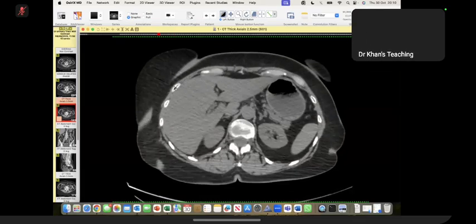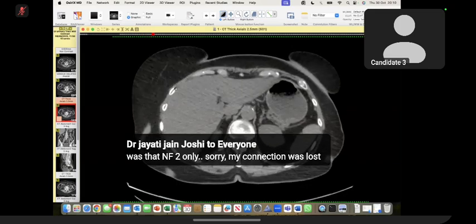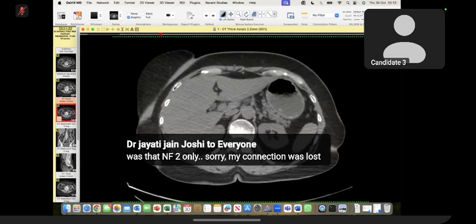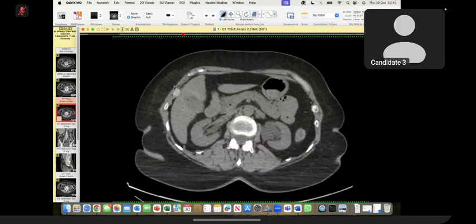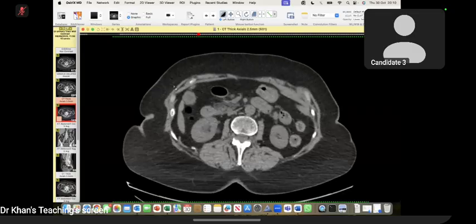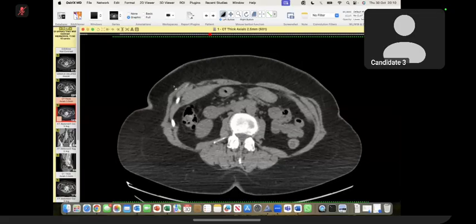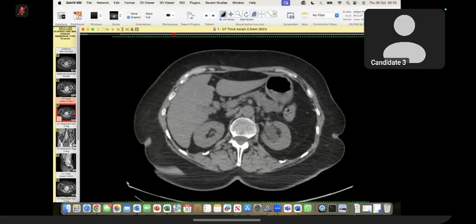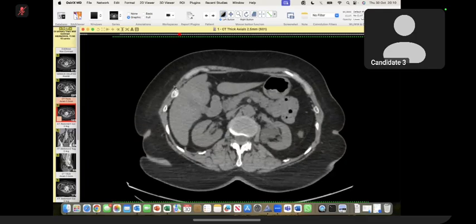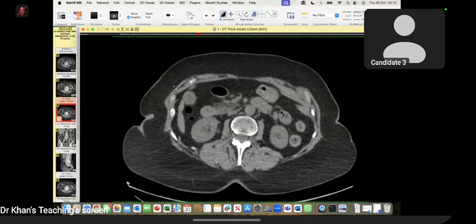I want you to concentrate on the kidneys. Yeah, okay, sure. So I'm presented with plain axial cuts of CT images of the abdomen for the female patient complaining of hydronephrosis. I'm examining both kidneys. Both kidneys show a dilated pelvicalyceal system, however the contents appear more isodense to me, more than of a fluid nature. She's a 32-year-old female.